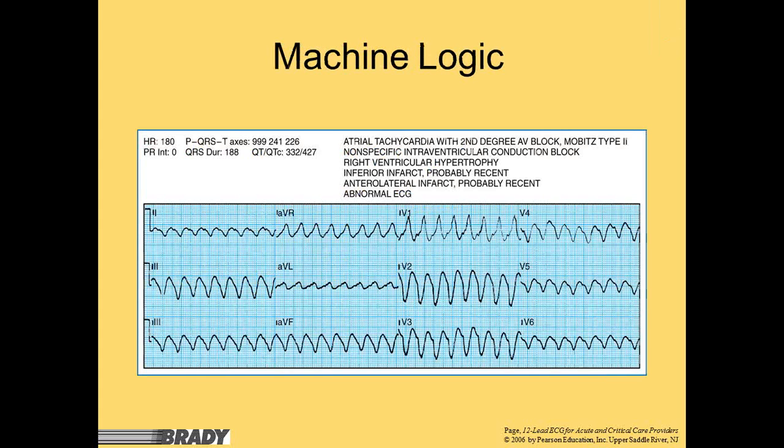So here is some machine logic. I think you can probably look at this and recognize what rhythm it is.